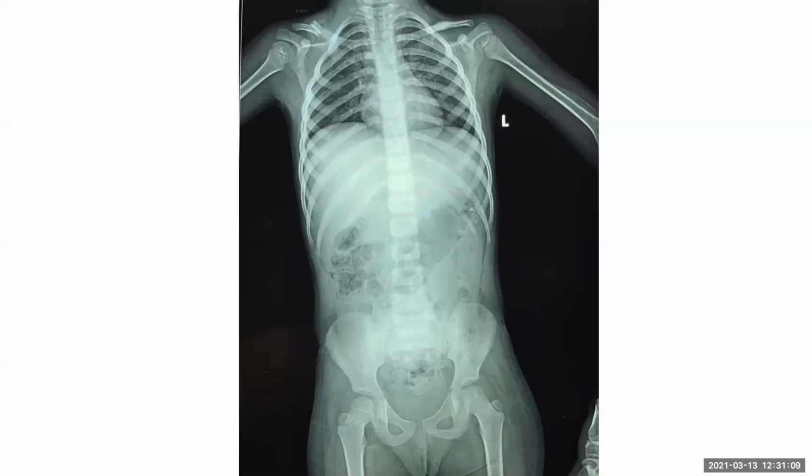Then along the left humerus distal aspect, there is some uniform periosteal reaction. So in a child with multiple fractures of different ages, my primary differential would be a non-accidental injury that I would like to rule out.